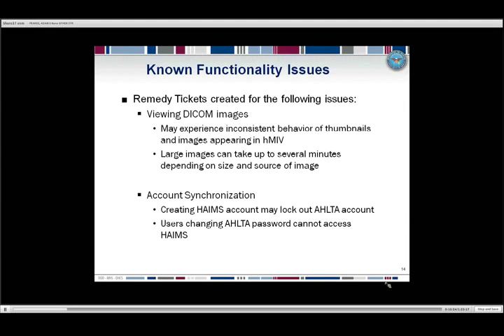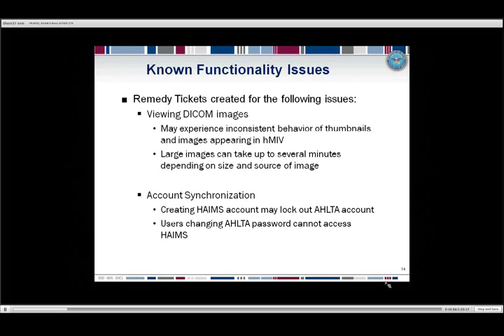There are a few known functionality issues that are being worked on. For example, when you want to view the DICOM image or the X-ray, the radiograph, the more slices or the more radiographs you're trying to pull up, the longer it may take to load. And that is all a restriction based upon how fast your internet connection is at your facility.